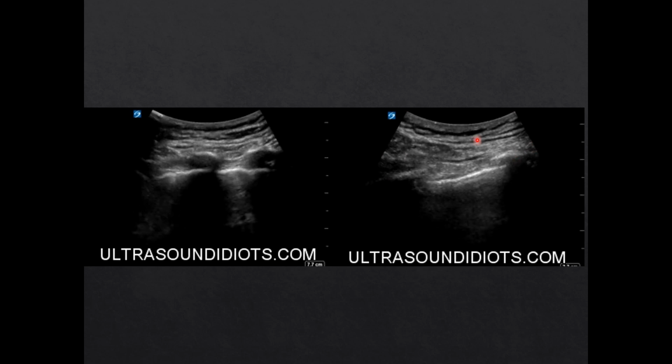We can't do that. This lung sliding will tell us it's 99 to 100% negative predictive value for a pneumothorax. If we see the lung sliding, then we can say, no, it's ruled out, it is not a pneumothorax. But if there is a lack of lung sliding, this could be due to other causes, perhaps due to scarring, or maybe a big bleb on the surface of the lung that isn't quite sliding.